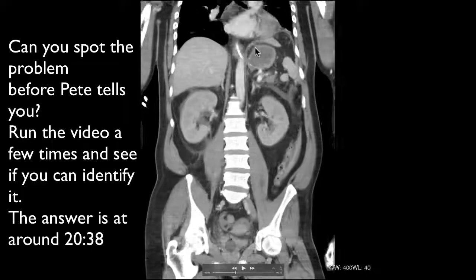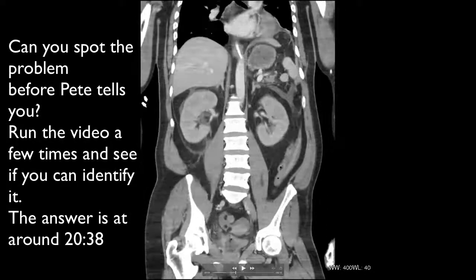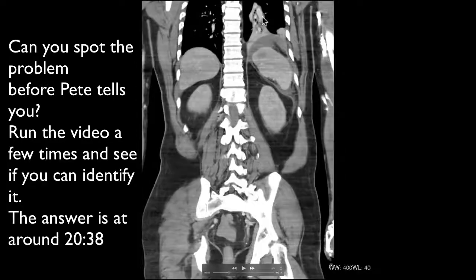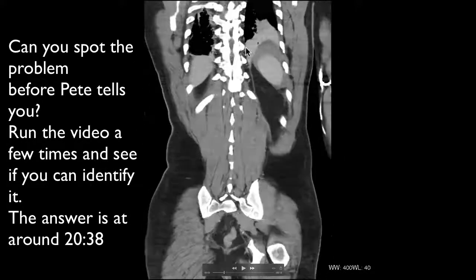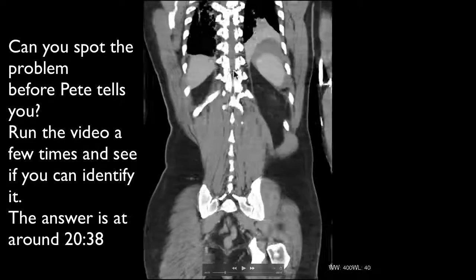And this one, as I say, you'd start with the lungs, and there's something to see in the lungs here. You can see this is an air bronchogram here, and you've got a bit of fluid at the base there, the left lung base, with a bit of associated consolidation. Again, with the inflammation you get with pancreatitis, you often get changes in the lungs. There's more consolidation there on the left and the right.